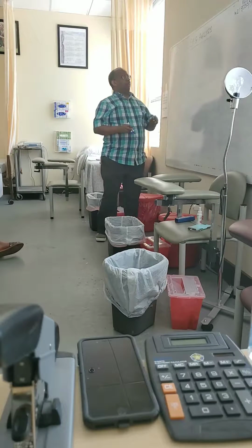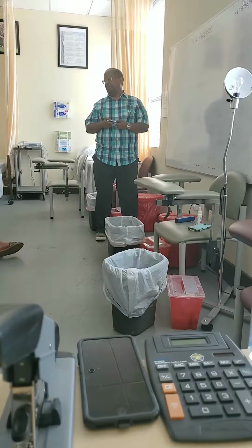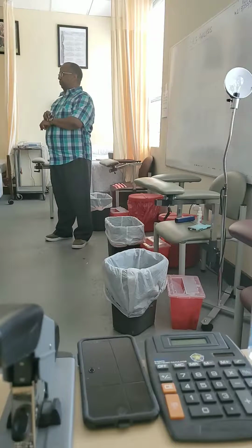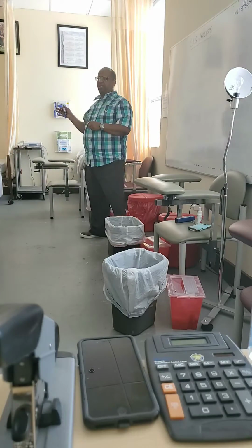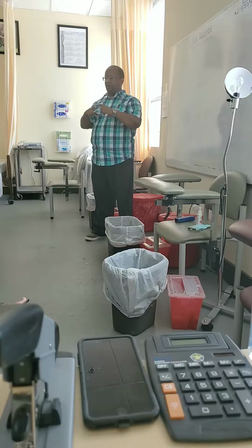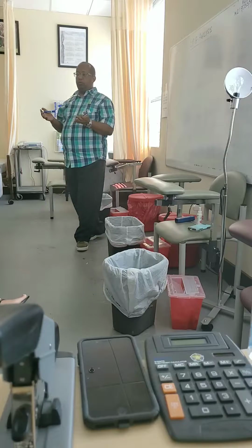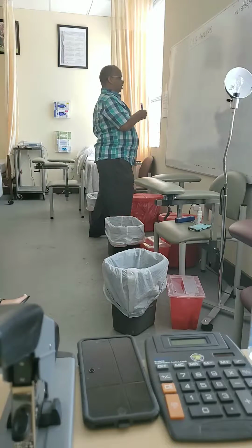Okay, our topic for today is EKG analysis. After you do your EKG, that means after you print out your EKG, you have your record or your printout. So you need to know the two most important things in that.